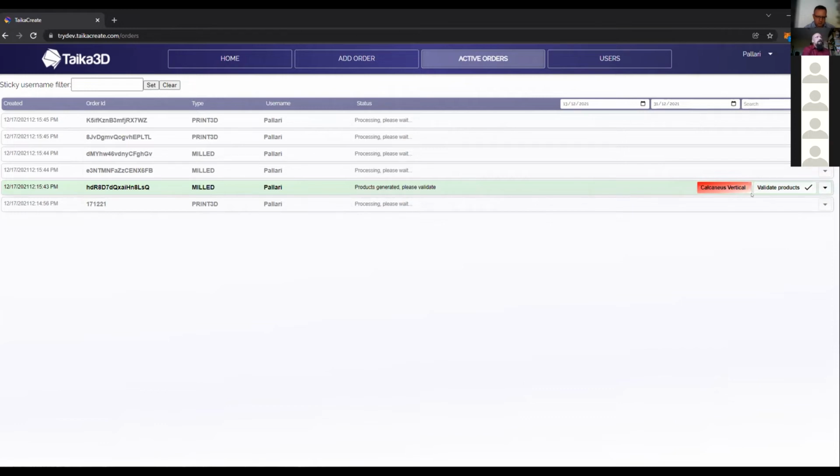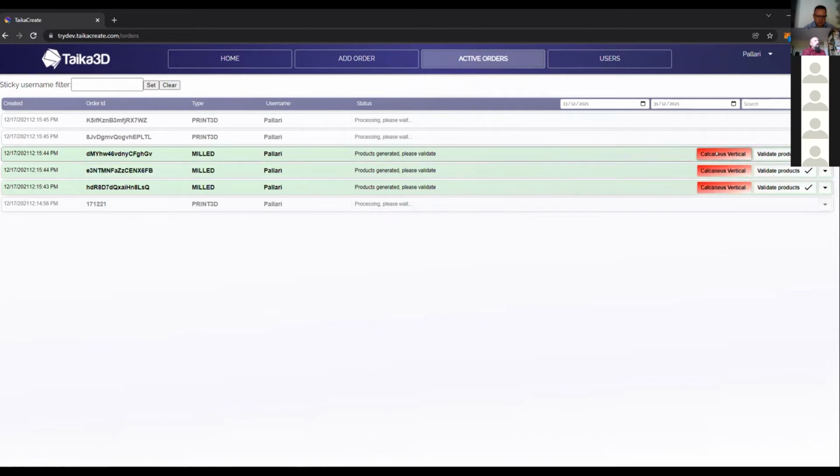So we can basically just directly jump into validating our designs, or let's wait a bit until we have a couple more.